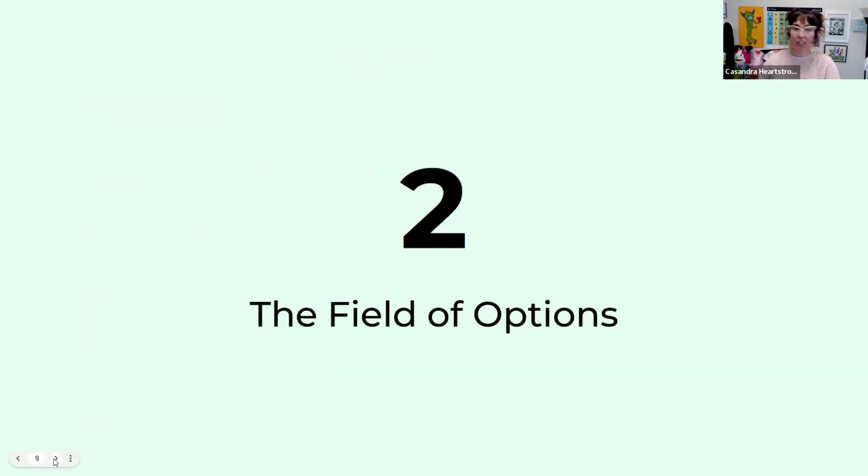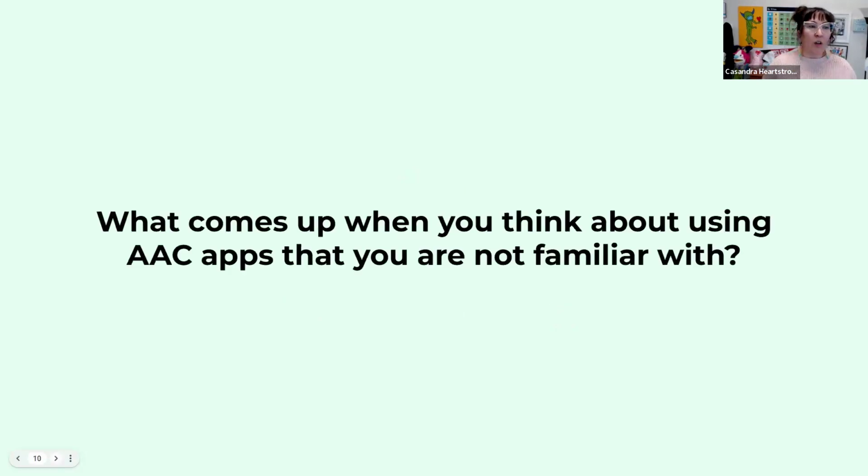So number two, we're just going to explore our field of options here. And I'm going to take a look at my AAC that's charging up over here, make sure it's working okay. Excellent. So let's look at our field of options. What comes up for you when you think about using an AAC app that you're not familiar with?